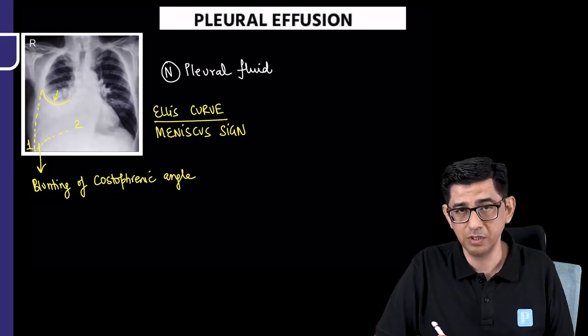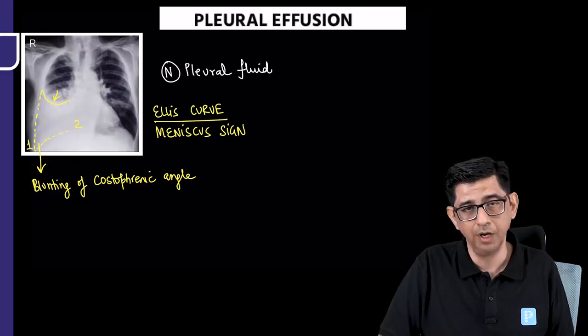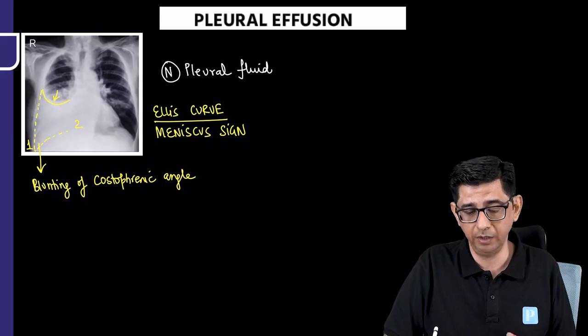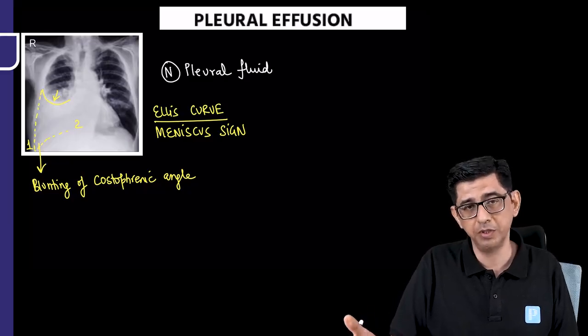The reason for this is that in the later part of this video, I'm going to show you a convexity in this area, and that's going to change the entire diagnosis. So I would like to keep the mystery wrapped up at the moment, and when the time comes, I'm going to show you an X-ray where there's a convexity present. Let's now focus on some normal baseline information as well.